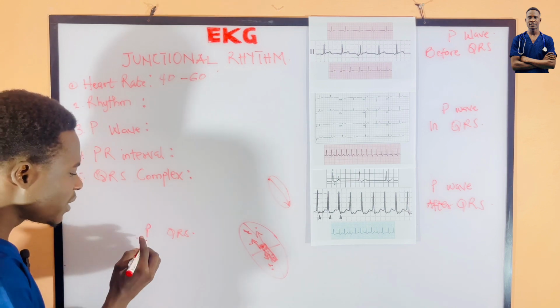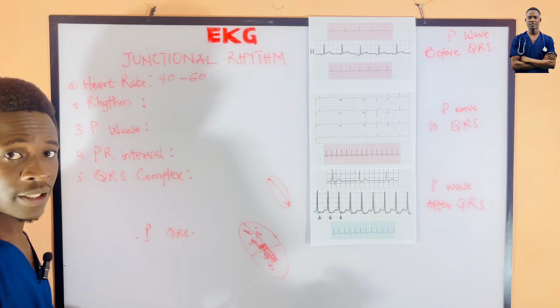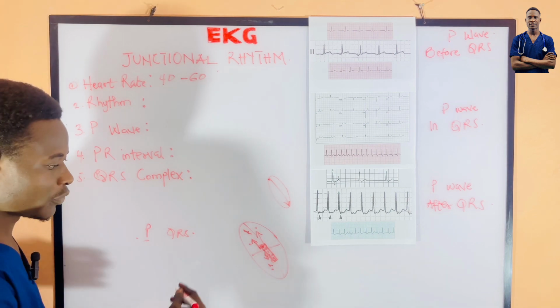Now this P wave, what is it? Is it going to be positive? Is it going to be negative? Is it going to be biphasic? Now look at something over here.